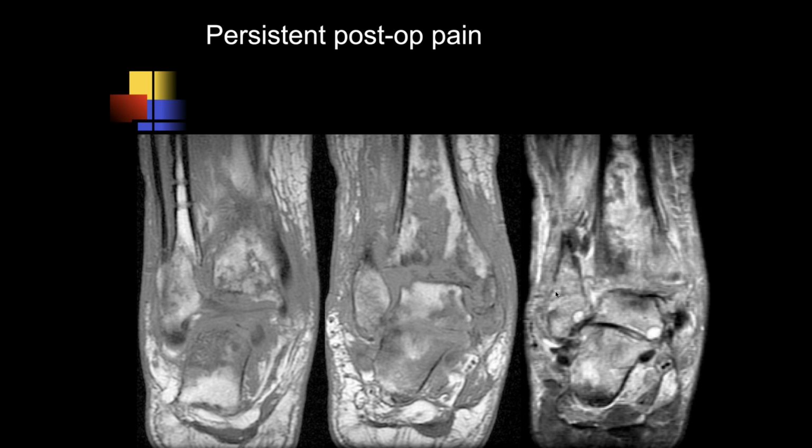If they had some kind of surgery here, I don't see any signs of it. Here are the screw holes in the fibula, John. That may be a couple of screws that went in to stabilize the fibula to the tibia because it's a high ankle fracture, but I'm not sure that started the thing. Yeah, they put a plate in and they went in and removed all the hardware in this patient. If they did, that was not something that I would have recommended. That's for sure.